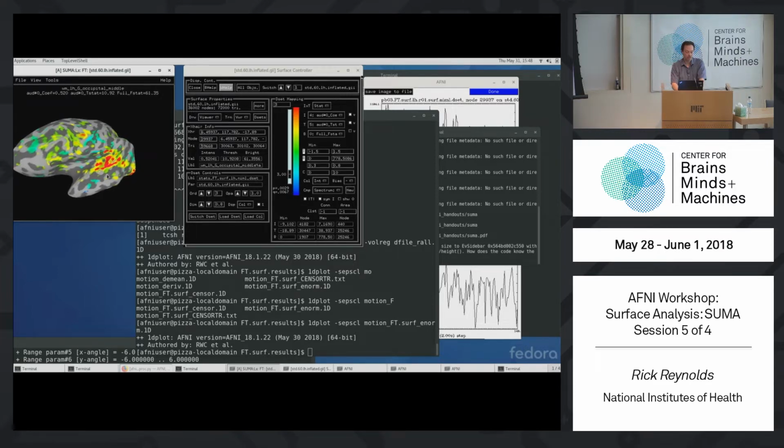What is cool here is this upside down T or something, the Y image. We have this strong intensity area, surviving threshold, that is anatomically sharp. It's not a big blob. I'm not studying this in depth. I'm not looking at the time series. I haven't really spent much time with this, but at a glance, that looks really cool. It looks so well defined anatomically.